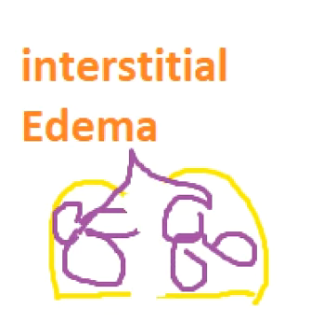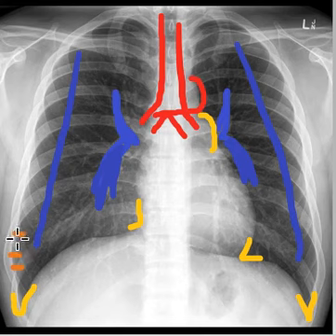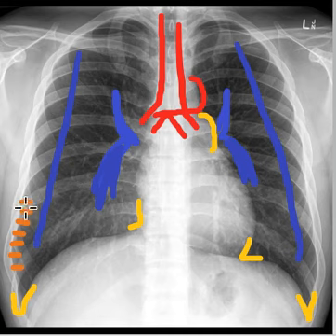When they become thick, we can see certain lines on the chest X-ray, and those lines are known as Kerley B lines. So you have this thickening of these septa because there is interstitial edema. Now there's fluid and thickening. The most peripheral part of the lung will show this edema of the interlobular septa, and you will see these lines, the Kerley B lines, which are basically telling us that the interstitium is now becoming edematous.